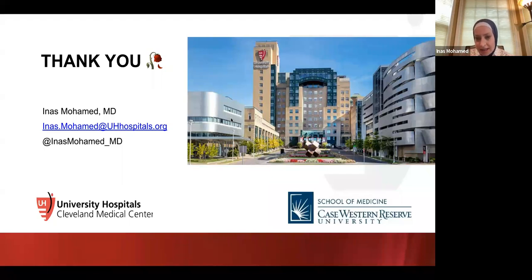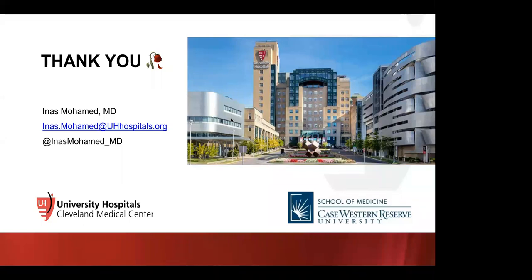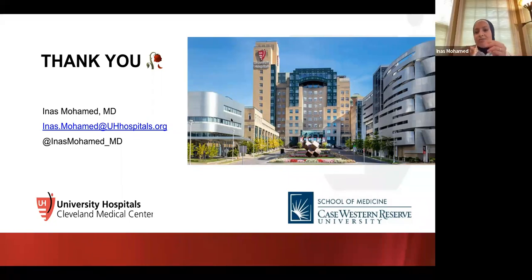I know, as I've been told, it's not widely used, but what we do is, if I think this is focal nodular hyperplasia, I make sure to give the patient EOVIST, and it's going to show you if it's really FNH. Because with FNH, you just let go, don't do anything, it's done. We don't have to bother around it. No follow-up, nothing. The same for hemangiomas and cysts. So the approach is to assess each liver lesion separately. Exactly.